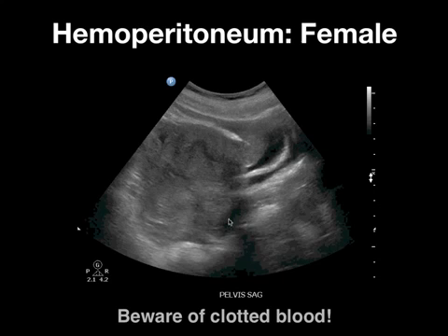So here's a patient that had a ruptured ectopic, and if you look here, you've got a couple anechoic areas here. So the question is, which one's a urinary bladder? This is actually the urinary bladder here. You've got the echogenic wall surrounding it here. It's got a nice contained shape to it. You could look at this one at first and say, boy, this has got to be the urinary bladder. But if you look, there's no wall up in here. And you can see how it's interacting with the surrounding structures. This is actually clotted blood in the anterior cul-de-sac, and this is all clotted blood posteriorly.